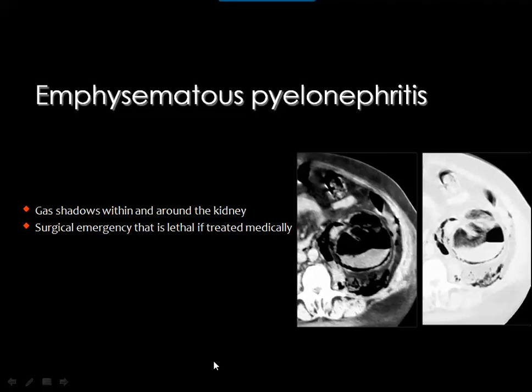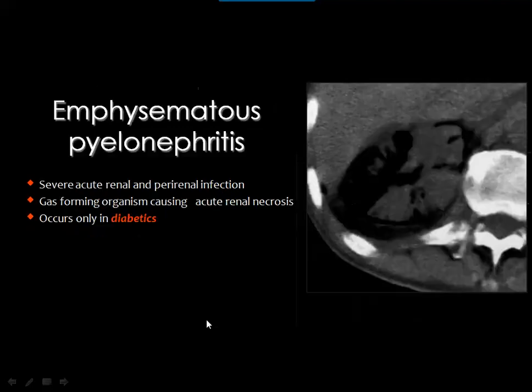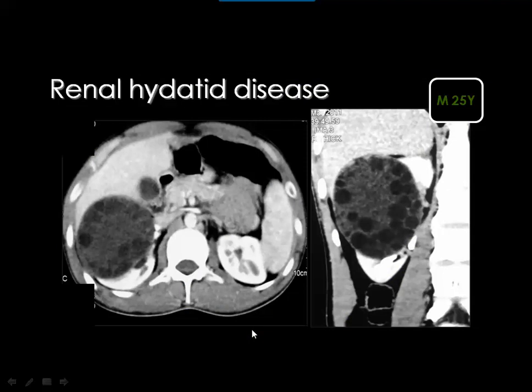Emphysematous pyelonephritis is the presence of gas in the collecting system as well as in the renal parenchyma and also in the perinephric space. This emphysematous pyelonephritis is usually seen in diabetic patients, and it indicates a severe type of inflammation. Here, a non-contrast study of the right kidney shows extensive air within the renal parenchyma and the peri- and paranephric spaces, diagnostic of emphysematous pyelonephritis.